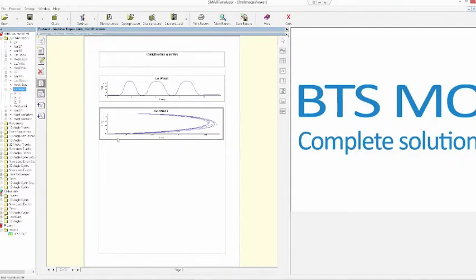Okay, so as you can see, you have on the x-axis the x component of the marker, and on the y-axis the y component of the marker. So the plane y-x is the sagittal plane for example, and so this is the meaning of this type of visualization that we can use into our report.